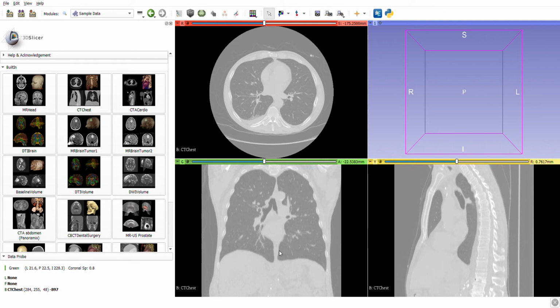Now from all these different parts of the body and the tissues as well, which are included in your CT scan of the chest, I will separate the spinal cord part. And the process for doing that is known as segmentation. Now how to do that?